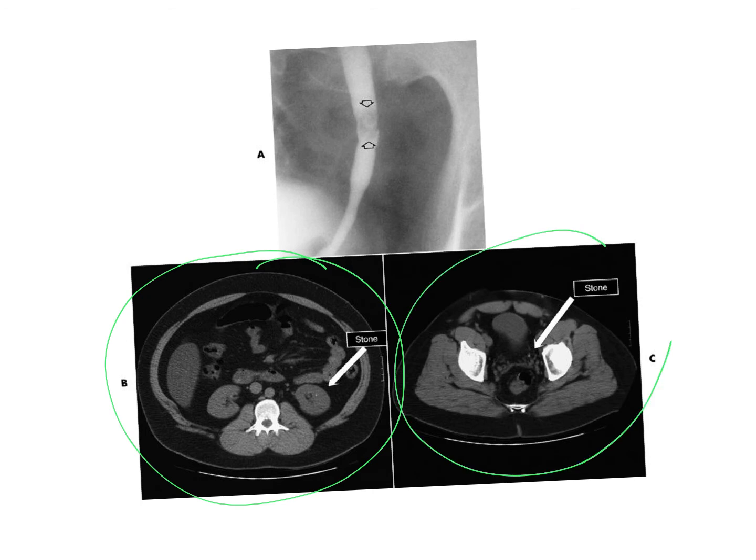Okay, the last x-ray and CT, which we can see here, is of the renal calculi or stone. Typically, when you are looking to see if there's a stone present within a patient's urinary system, you do not want to add contrast like they've done here. Luckily, they were able to identify the stone here, even with contrast occurring in what looks like the ureter right now. So this would be a ureteral calculi. But anyway, you don't usually use contrast because it can tend to obscure the stone.